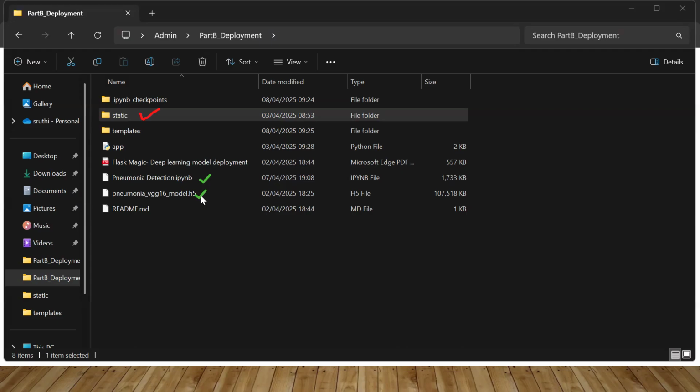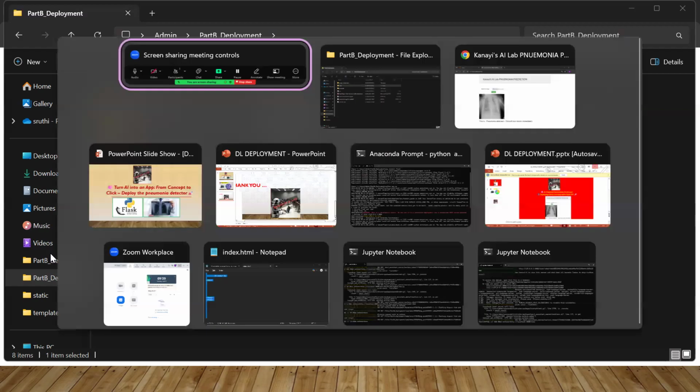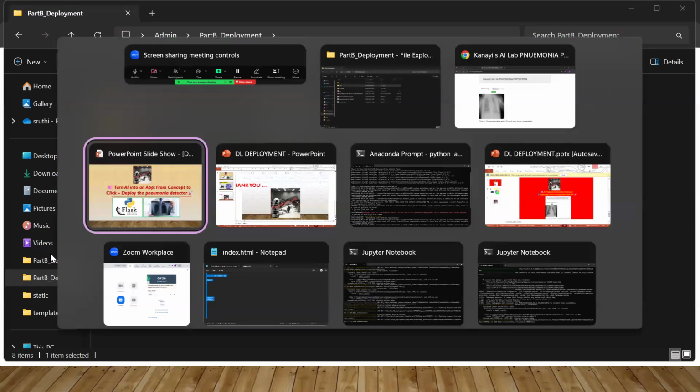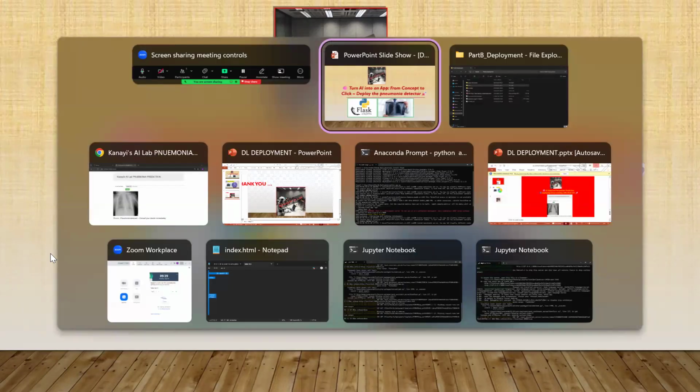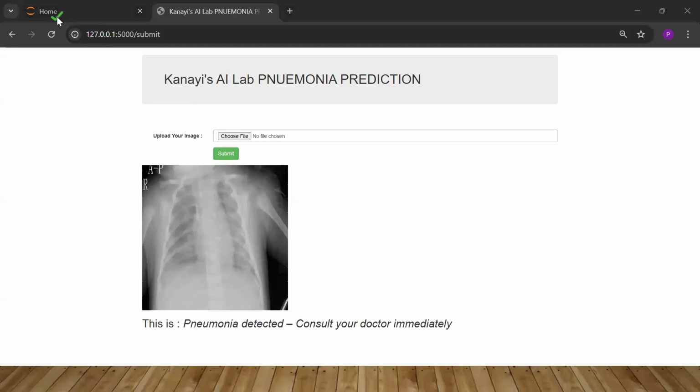As I mentioned, I am not going to touch on it in detail, but for your understanding, I can take you through the notebook to mention the major and important steps. So I am going to connect to my Jupyter notebook. Give me a second. My notebook is in my browser only. Let us go to Chrome. So here is my home tab. Let us close all the distractions. I'm just connecting to my Jupyter Notebook homepage.